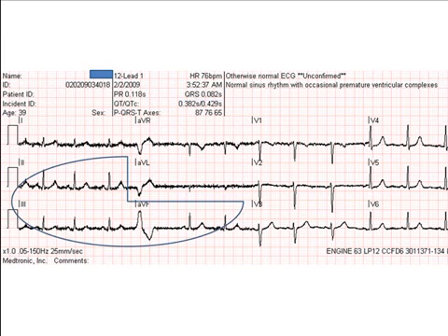Do you see any? There is no ST elevation, so as long as the patient's blood pressure tolerates it, you can start to administer nitrates. Looking at the other leads, do you see any ST elevation? So, even though there is no other ST elevation, this patient will be treated appropriately, including a code 3 transport, unless the pain completely resolved itself. Remember, a patient does not have to have ST elevation to have an MI. We are just not going to activate the cath lab.